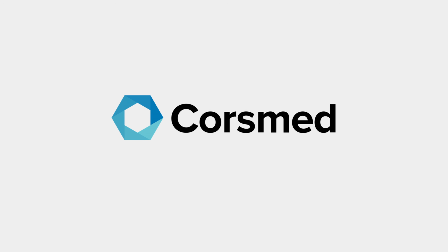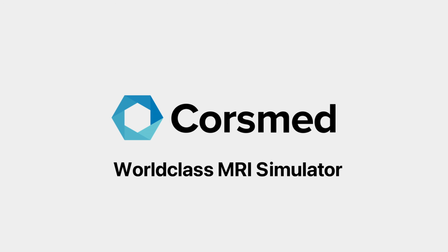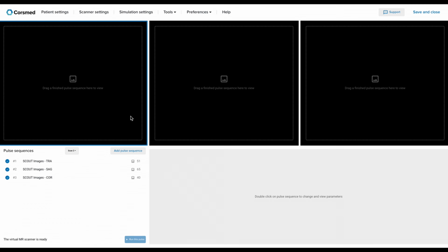Today we're going to look at cardiac MRI, and specifically we're going to look at viability and myocardial infarction. This is going to be a two-part video, so the first one is going to be on the cardiac function. Let's go. Here we have the Corsmed MRI simulator, which is where I'll demonstrate how to run this protocol.